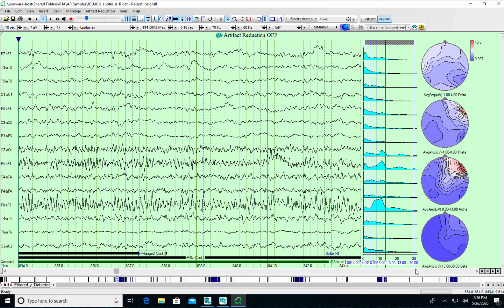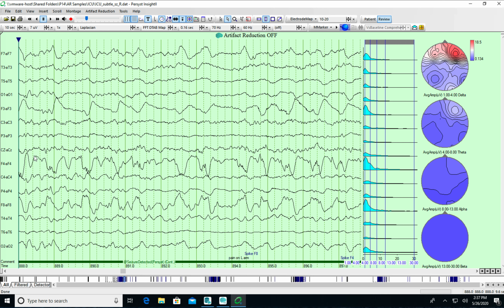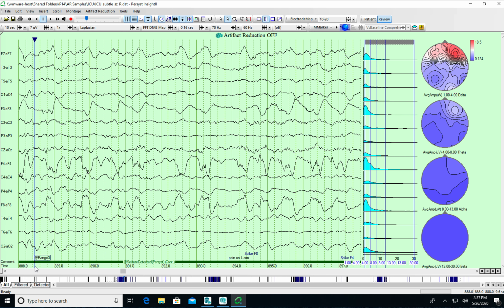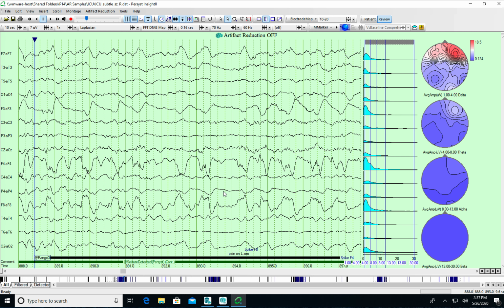Let's page a little further along, and we're going to put a range in here. I'm going to call this 3. All right, and we're going to mark this one. We'll just go over here, grab the word end, and drop it on the page. It's 9 seconds. So I've got three comments.